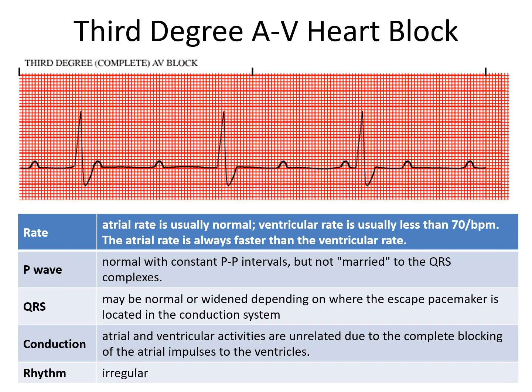A third-degree AV heart block is also referred to as a complete heart block. Initially, as a new student, somebody who's learning how to read EKGs, it can be very difficult to distinguish between a Mobitz type 2 second-degree heart block and a third-degree heart block. So I'm not going to ask you to do that because it can be very confusing. However, you do need to know how to treat these more advanced heart blocks. Okay, we'll talk about that. So let's look at this third-degree heart block.